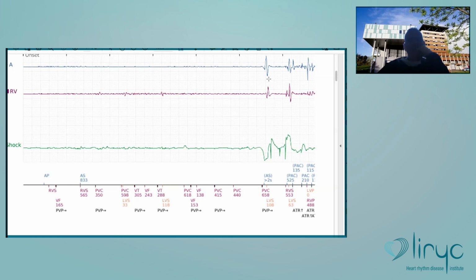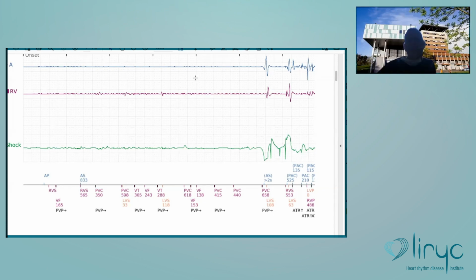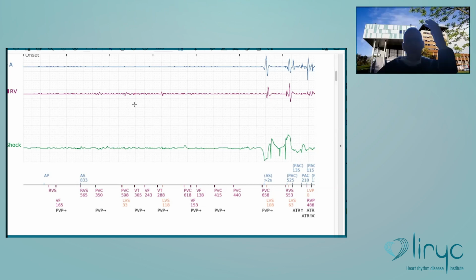It's also an electrical scalpel. Okay, so maybe the patient, well, I'm not sure. It's inhibited during the surgery, or no. This is cardiac surgery, during cardioplegia. You see, a typical cardiac surgery. So if in your center you have a cardiac surgeon or cardiac surgery, just know that this kind of tracing is very classical.